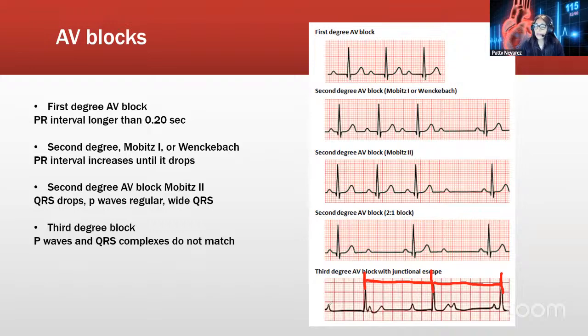The second thing that we're going to notice is the P waves. So if I measure the P waves, they're all going to be matching at the same time.